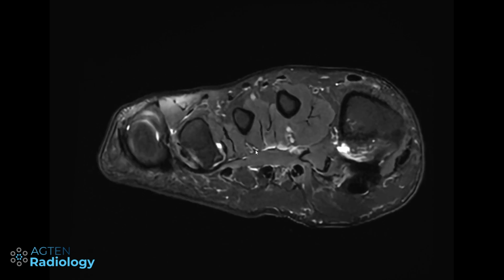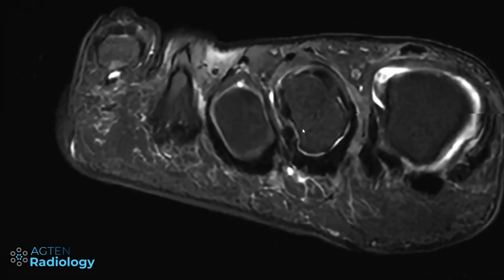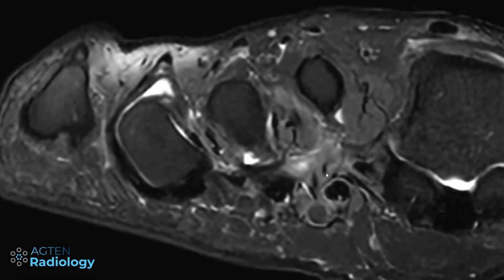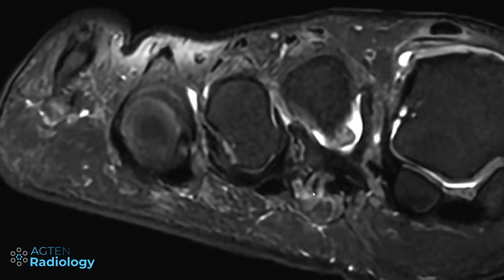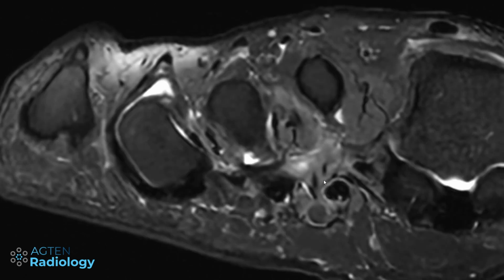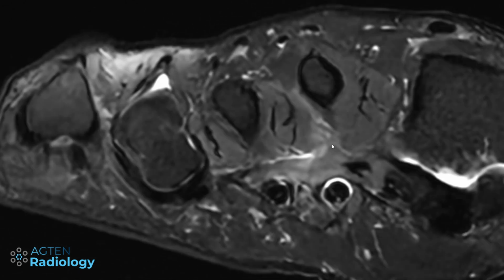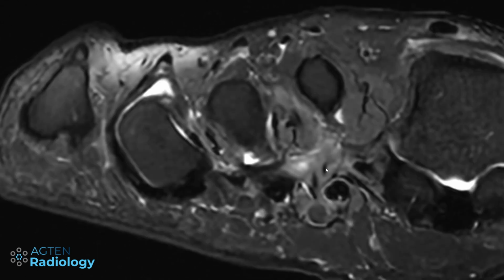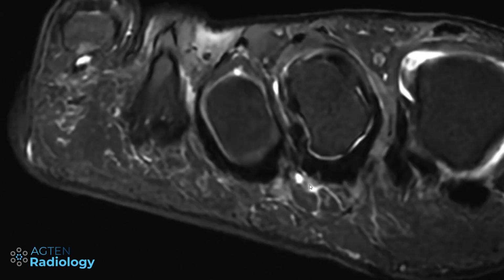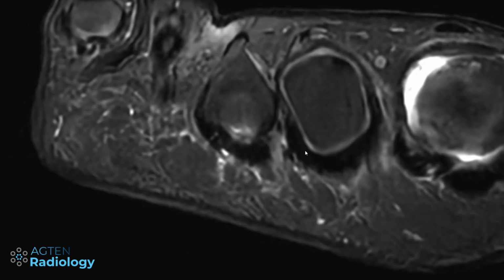We see some vessels here and there, and then we see some edema here, and then, very hard to appreciate, you can see this tiny black stuff here. It's not part of the ligament. It's not the tendon. It's actually where we should have the transition of the vein. So when we go more here, let's follow the metatarsal veins for a second. Now it becomes a little bit blurry, unfortunately, and then we start to see something black here and there, and then it's okay again, and then either some veins, or maybe there are even some additional cysts here.